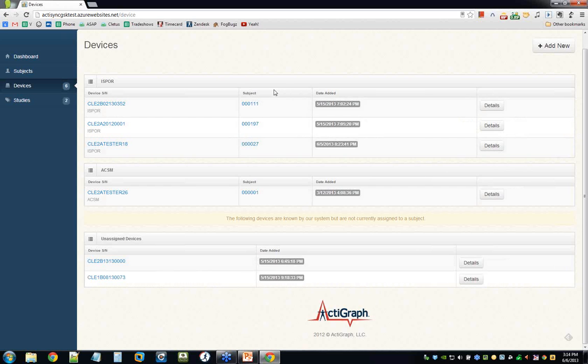We plan to add more to this later. You might see us add what's the firmware version, what was covered in that firmware update, what's the age of this device, is it available for trade-in, and so we'd like to augment the system and make it a little more useful as far as an inventory management system as well.